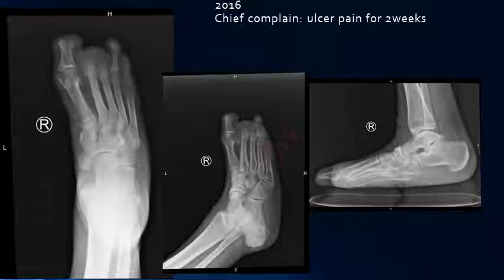And we cannot really see it in the AP view, but we can see it in the oblique. And this is why we take a minimum of 2 views, because some fractures are not possible to see in one image, but we can see it in this oblique. Most importantly, because of the high risk of bone infection, the doctor recommended an MRI.